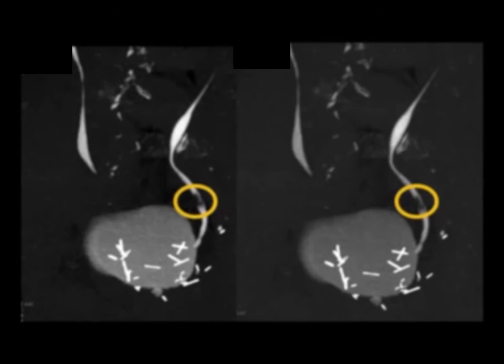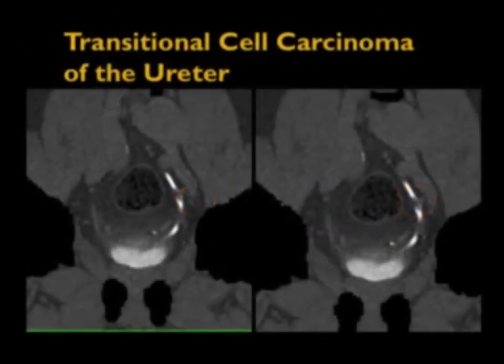Obvious transitional cell carcinoma. Or this case, in a patient who's had a loop already, when you look very carefully and you raise the images, you can see the patient has a lesion in the ureter. A very important thing this case shows is you can have a fairly good-sized transitional cell of the ureter and it's still not obstructing the ureter or kidney. We always think about obstruction, but you don't need to see it. But look how obvious this lesion again is, transitional cell carcinoma.